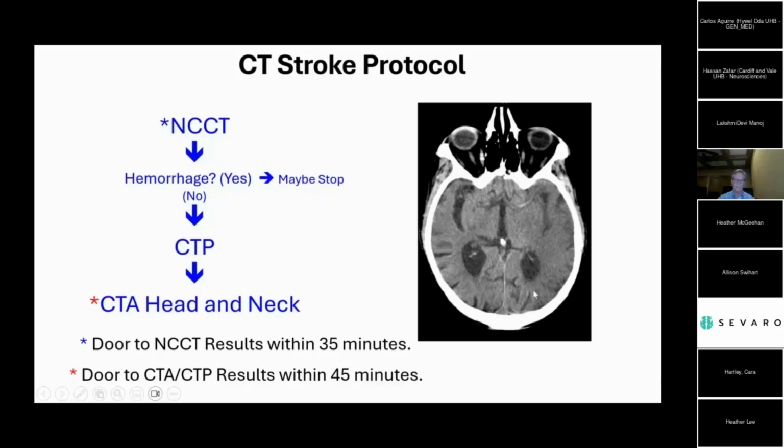Now look at the disease side. First, if you step back, this entire side of the brain on the left side is darker. And if you look at the difference between the cortex, the gray matter, and the white matter, it's gone. So this is a stroke with a non-contrast CT. In addition, for this case, we kind of have a bonus. You see this white thing right here? That's the thrombus with the M1 segment, so that's a dense MCA.